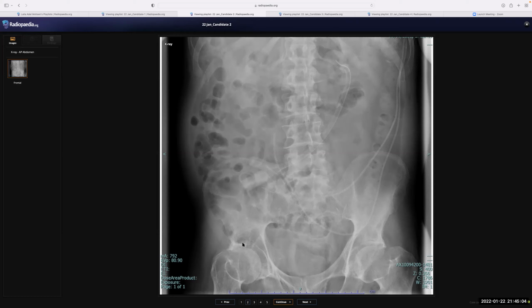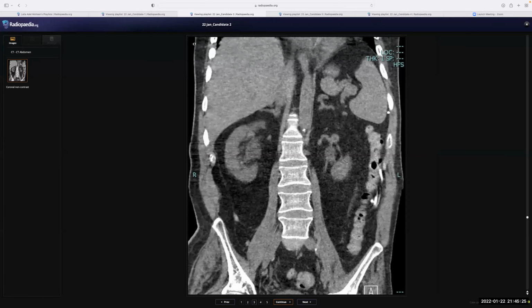Okay, so the patient has presented with sepsis. As I could not find any pinpoint reason for this, I would discuss with the clinician and proceed further, either with ultrasound abdomen as a first step or directly to contrast enhanced CT abdomen, to find a source of sepsis within this patient. Okay, so the ultrasound was normal. So they requested the CT.